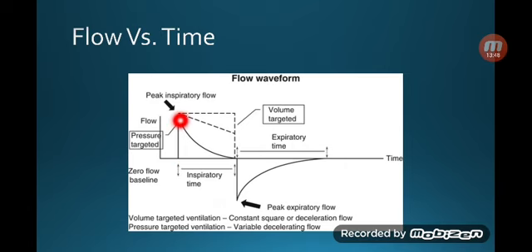So you go in really quickly because the lung doesn't have anything except for the PEEP from the pressure point of view, and then the ventilator keeps going down with the flow steady, really slowly, and then the valves close and keep the pressure in until the inspiratory time is done, and then the flow goes quickly out, and then there's a steady decline of the flow because of the amount going out. Usually it goes out really slowly after the highest pressure pushes out, which is basically physics.